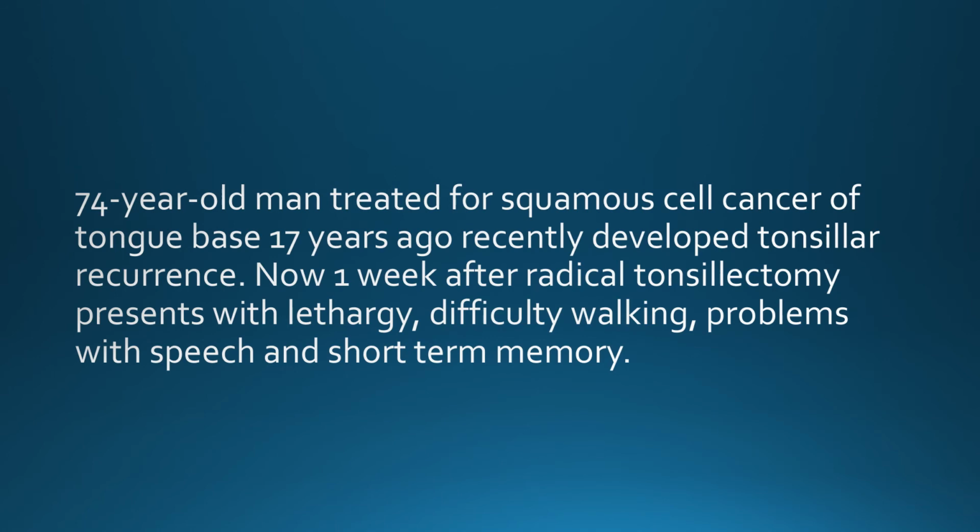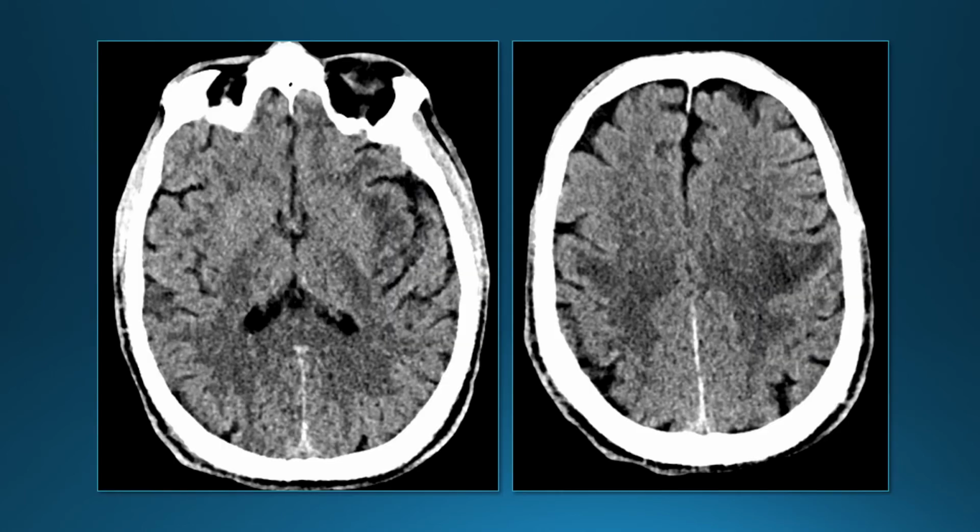Next, a 74-year-old man treated for squamous cancer of the tongue base many years ago. Recently developed a recurrent tonsillar cancer, and now after surgery, he came in with lethargy, difficulty walking, and speech and memory problems. He had an initial CT that shows some hypodensity bilaterally.